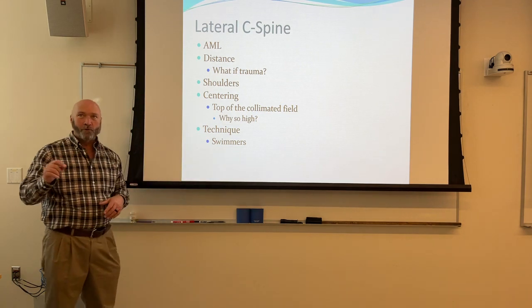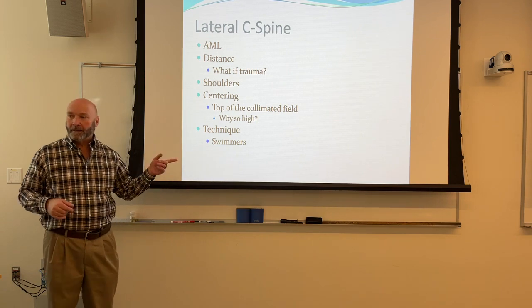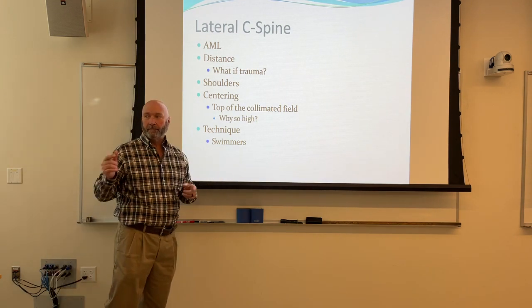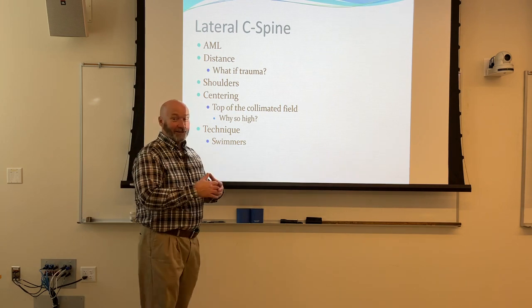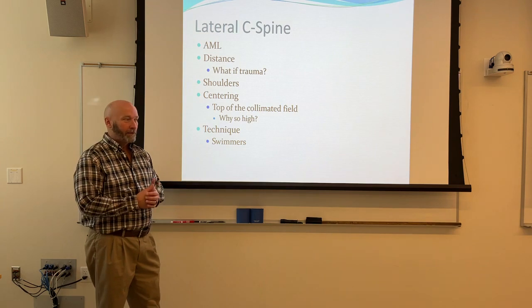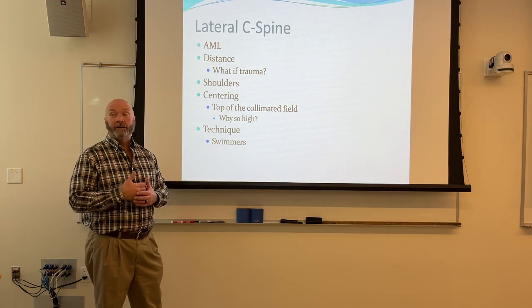And this is poor radiation protection, but if you're in a true trauma situation, you might get more of the C-spine, lower portion of the C-spine, if you intentionally misposition. This is a hint for y'all. This is not in any textbook, and again, it's poor radiation protection, but it's potentially good patient care all at the same time.